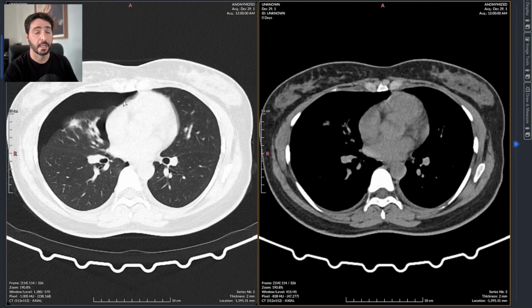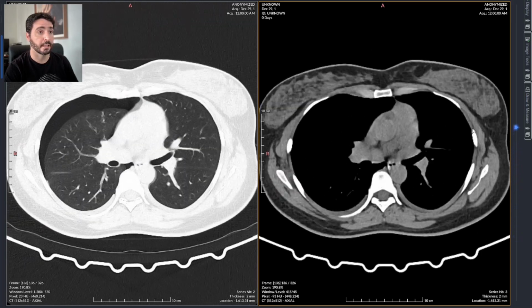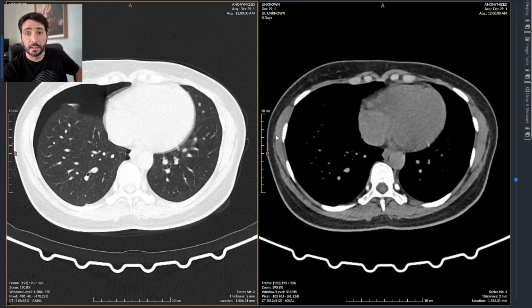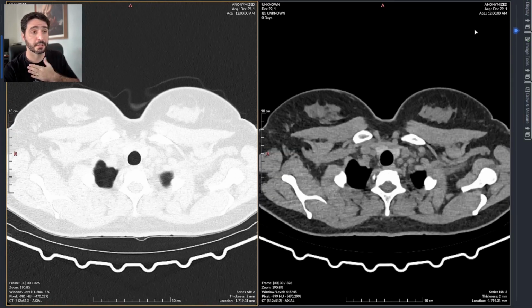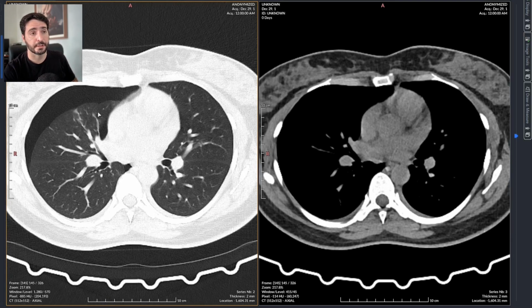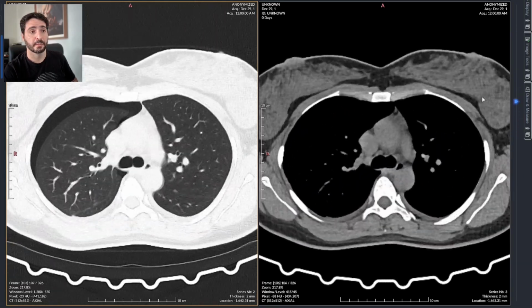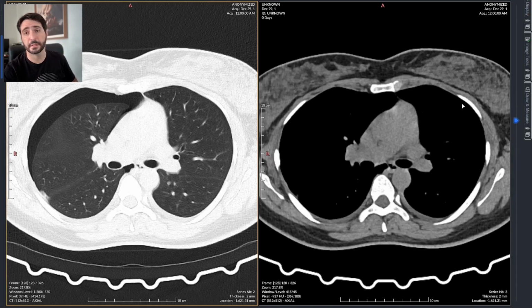It is a spontaneous pneumothorax. It is a pneumothorax that arose without trauma, and it's a very insidious and quite uncommon disease, usually affecting young patients, longilineal young patients, those tall and thin patients, usually males, and it's right here. You see the lung is reduced in volume. We can see some atelectasis to the middle lobe and to the upper lobe, and a small to moderate pneumothorax.